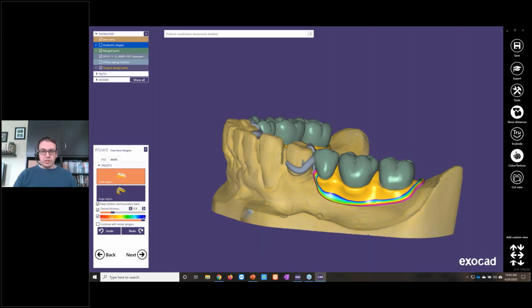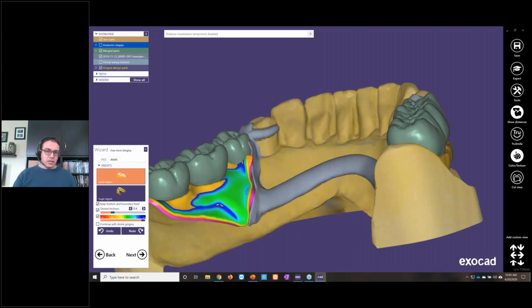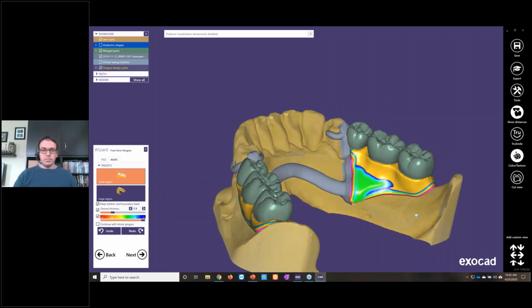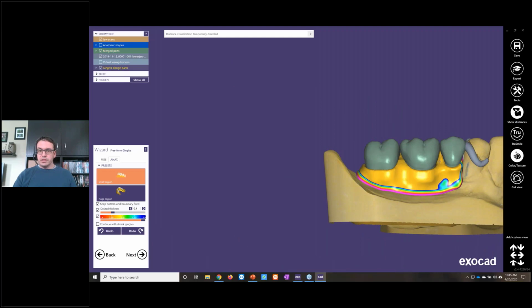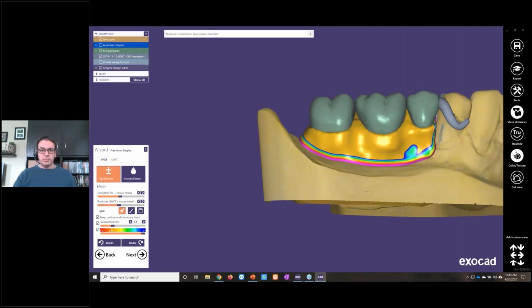To create sufficient material for the tooth pockets for these teeth here. The color map we see here has a checkbox over here, and it shows a thickness scale of the material in the wizard panel. On the other side of the arch, I'll pull up the interproximal gingiva here a little bit. And then we can switch to the freeform tab where we have add, remove, and smooth flatten tools available.